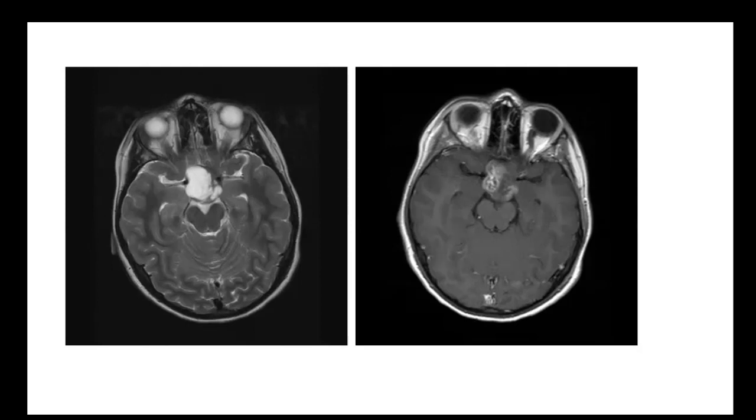Okay, so here are your choices. Do you think this is another craniopharyngioma, a hypothalamic hamartoma, an optic nerve glioma, or a Rathke's cyst?